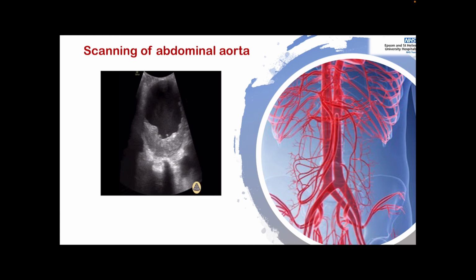This is one of the images of the abdominal aortic aneurysm. You can see all of this one is an aneurysm, and there is a hematoma or a clot formed. So if I want to check the dimension, I start from here, going all the way down, and include the thrombus. And this type of aneurysm, we call it smoking aneurysm. You can see here inside. Looks like this is the smoking aneurysm.